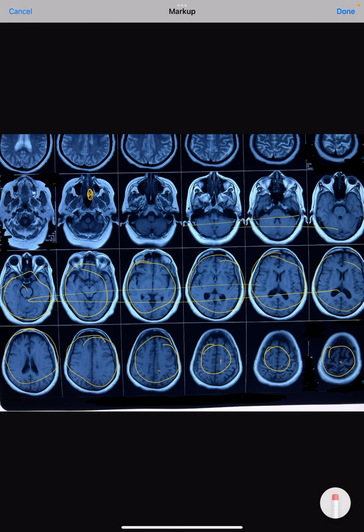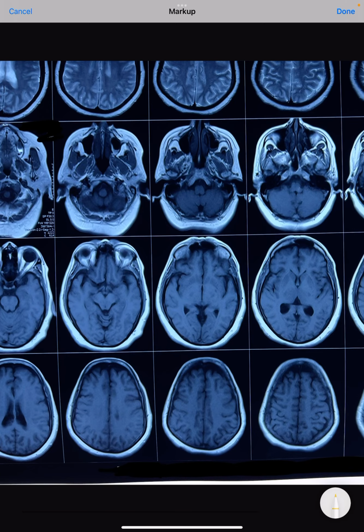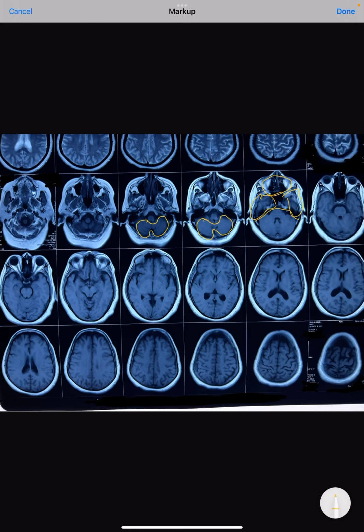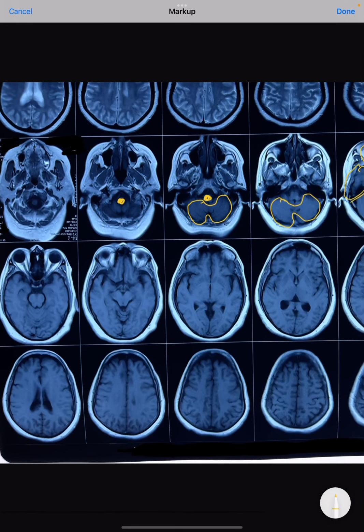So towards the lower portion of the brain, what we can see is the brainstem structure. The brainstem consists of the medulla oblongata, pons, and midbrain. It is very easy to understand. The lowermost portion which we can see here is all cerebellum. The cerebellum is the most posterior part, because this is the posterior cranial fossa, this is the middle cranial fossa, and this is the anterior cranial fossa. The lowest most part of the brainstem is the medulla.